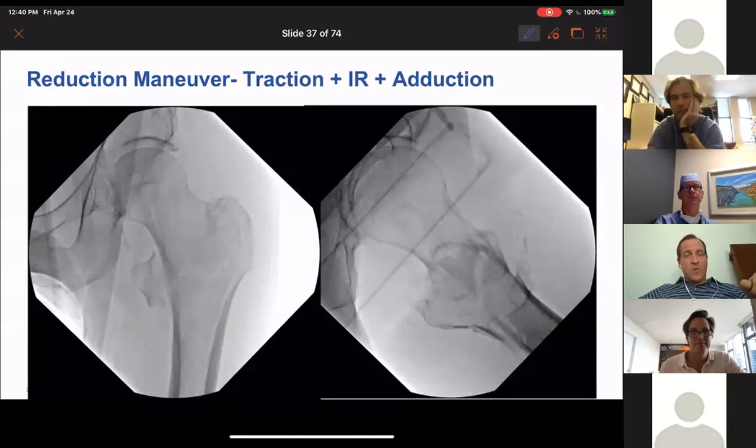But when you go to a true proximal femur lateral that doesn't account for the anteversion of the neck, it's just amazing how this lateral view, which looks everything you said, lined up, posterior cortex flat to the floor, you'll see something way off on the medial side. And so there's some fragments on the medial side that seem to be not moving with traction either. And it's amazing how different it can look with a little bit different rotation of the beam.